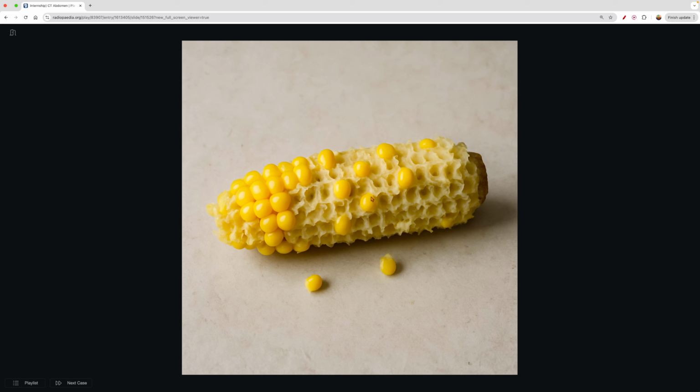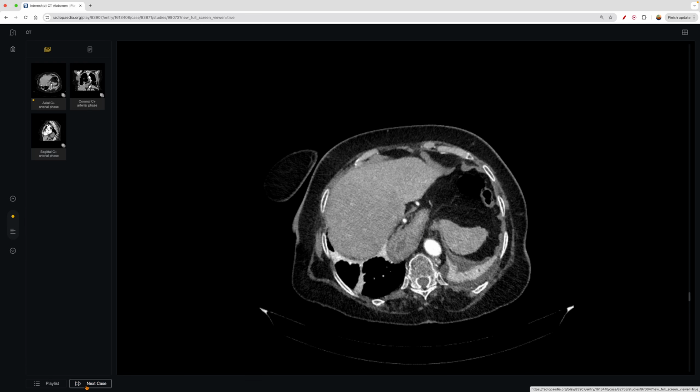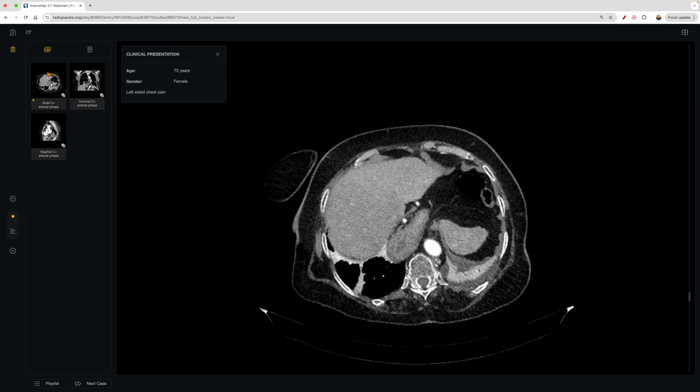If you think about these small areas here, these being the outpouchings, it looks somewhat similar to diverticular disease. And that's kind of how I like to think of it. You'll see it a couple of times, and then you'll start to realize it's pretty easy to identify. So that's a good one there.